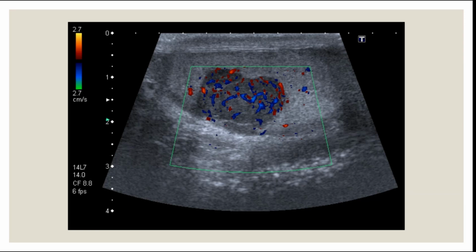Okay, I'll do this one if you guys want, and then the next one you can try. So this is Doppler ultrasound, color coded ultrasound in B mode as well, and you can see that there's a structure, an echogenic or hypoechogenic structure that has some blood flow possibly, and you can see that there's some turbulent blood flow going on, and it's actually seminoma. So it's a highly vascularized tumor. So yeah, you can use Doppler ultrasound for it.